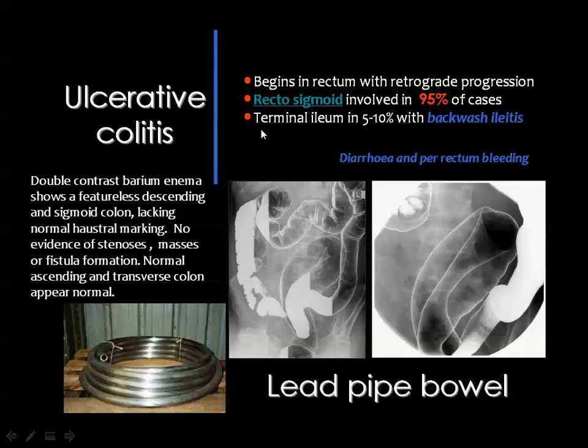Affection of the terminal ileum may occur in about 5 to 10% of the cases with what is known as backwash ileitis, where the ileocecal valve is incompetent, and the inflammatory process will affect the terminal ileum as well.